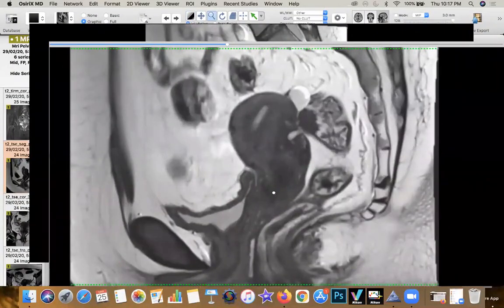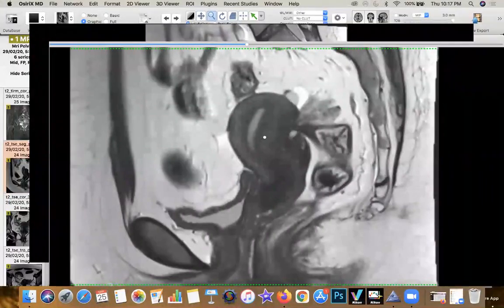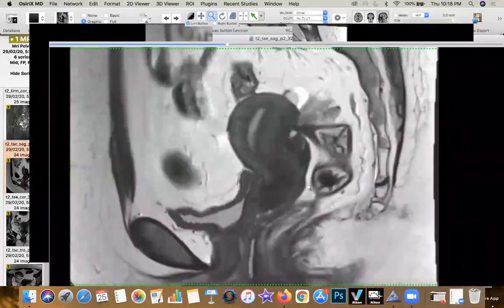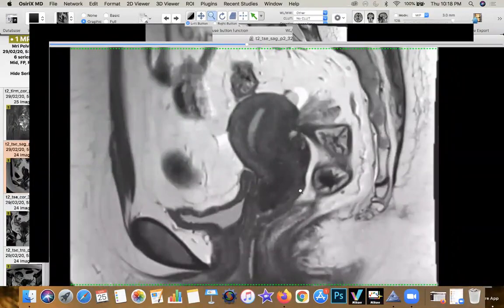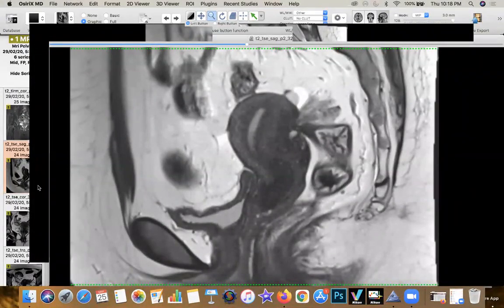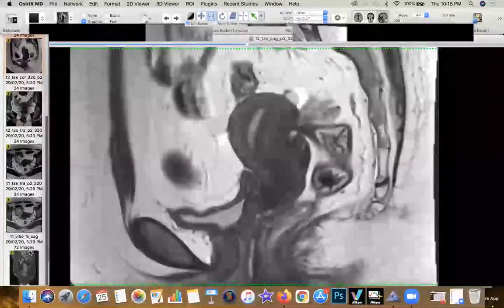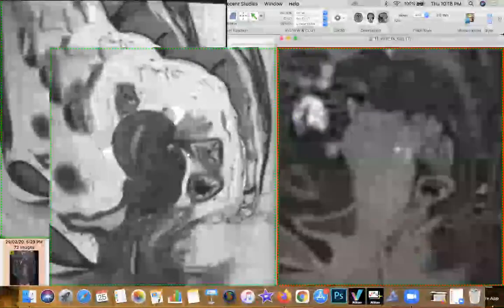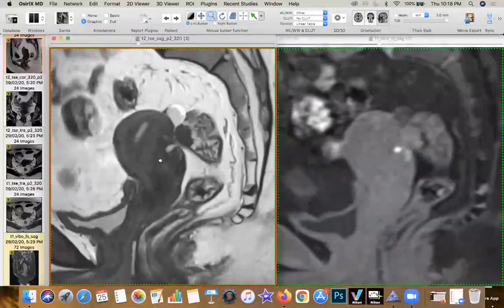So you have an anteverted anteflexed uterus, which is looking normal in size, but you can see the change in the contour. Please remember that thing, change in contour, thickening on the serosal surface. It could be anterior, posterior, or fundal, but this is a classic posterior thickening. You see the retrotipping, the retraction, the concavity, the thickening at the concavity itself. So the depth of the concavity should have the thickening. Within that thickening, you can see glands, which can be hemorrhagic or non-hemorrhagic. So this is hemorrhagic, and you can get non-hemorrhagic glands, which are slightly lower down here.